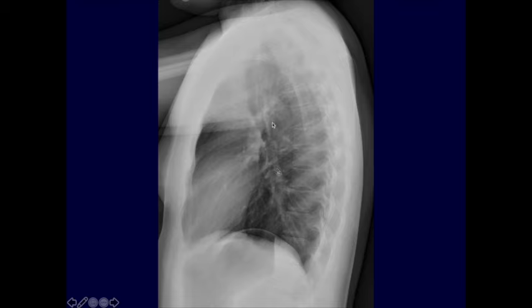Get used to what that normal hila looks like, because the lateral can be very helpful to determine if there is true adenopathy. Because beginners are usually a little bit worse at looking at the lateral films compared with the PA films, I'm going to give you a very simplified approach to the lateral chest x-ray. We're going to look at 5 main things, and then I'll mention a few others. But if you remember those 5 things, you're well ahead of the curve.